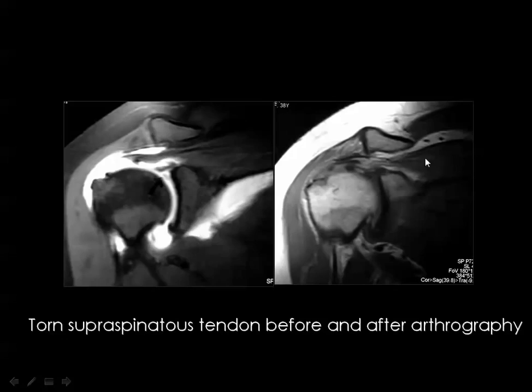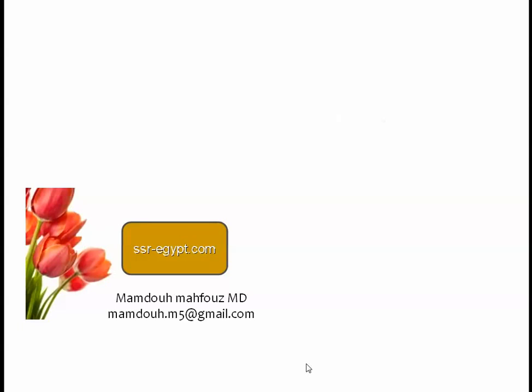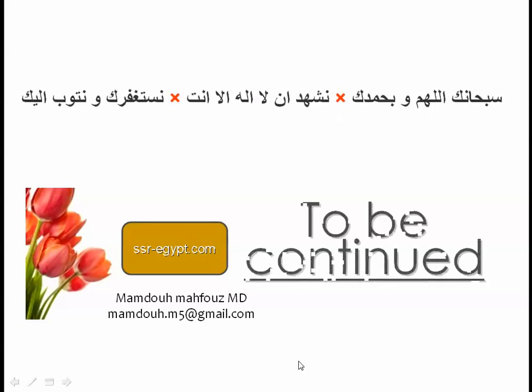Here you can suspect the injuries of the supraspinatus tendon, but you are not able to evaluate the superior labrum, for example. But here you can see full thickness tear of the supraspinatus tendon with retraction and a gap between the cut edge of the tendon and its insertion site. And also you can see this superior labrum with an internal bright signal denoting a SLAP injury, as I will explain later on. This was the end of the first part of the imaging of the shoulder.